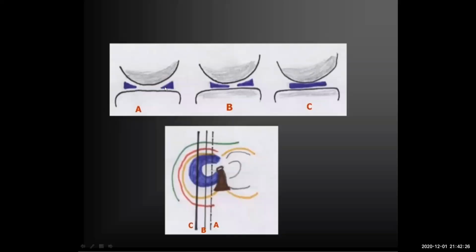This color is well contained inside. You will never find a white color inside this blue color. It should be homogeneously black on the MRI, as I will show you. Usually the normal structure looks black. Here it is just blue for explanation.